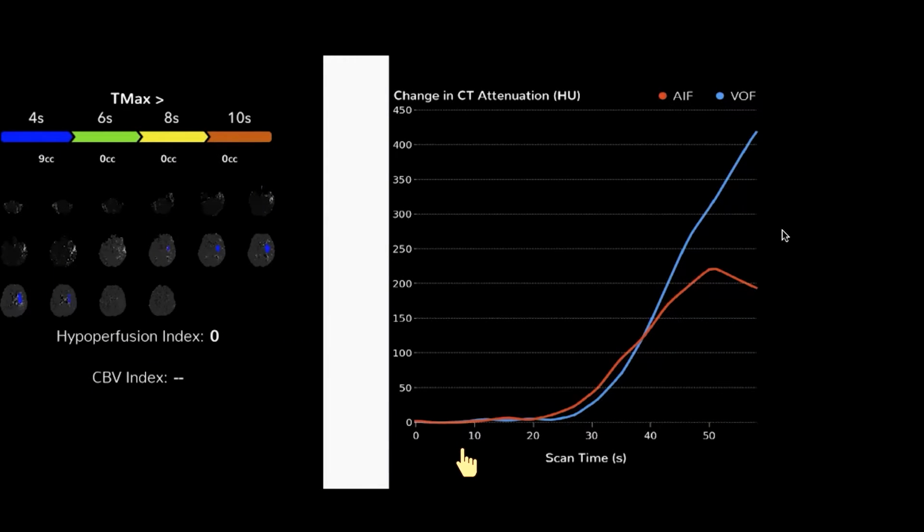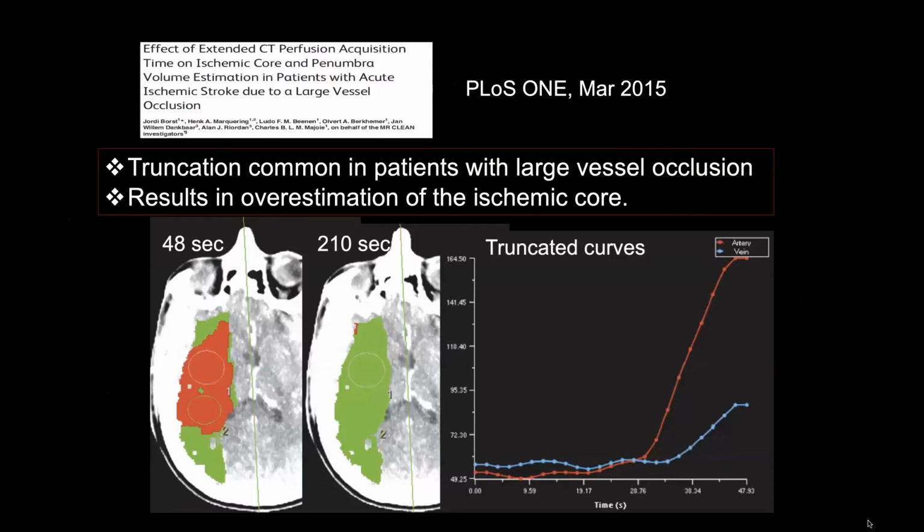I've got a long baseline. It's trying to go up, right? There is a little bit of upslope, but really no downslope. So this is a suboptimal curve. Why are we talking about these time density curves? Okay, so let's just understand one thing.